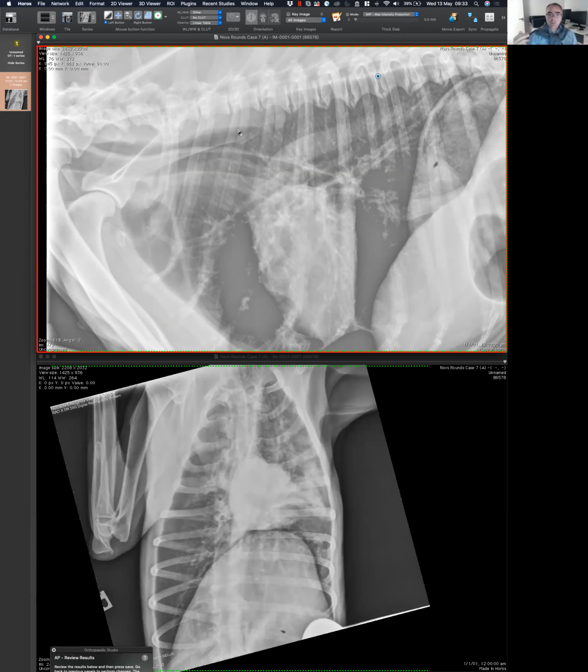Then the next question is, where is that gas? The two options are pneumomediastinum or gas in the esophagus. Which one are you going to pick and why? I'd say probably in the esophagus. It's too limited to be in the mediastinum, and usually pneumomediastinum silhouettes structures better. Very good, the perfect answer. So it seems to be contained. And why contained? Because if that gas were free, as in a pneumomediastinum, then we would be able to see the left subclavian, brachiocephalic arch, cranial vena cava, and actually most of the time we see the outer contour of the esophagus as well. Make sense? Not only the trachea, but the esophagus, because now that gas is surrounding everything. So agree, that is just gas in the esophagus.